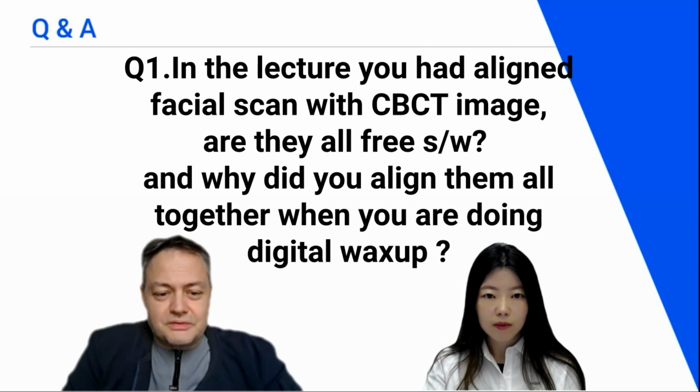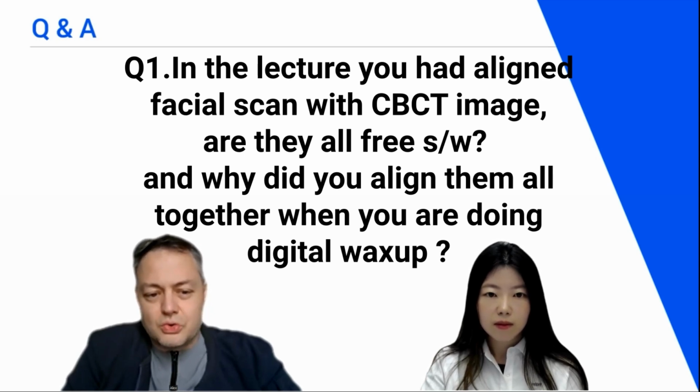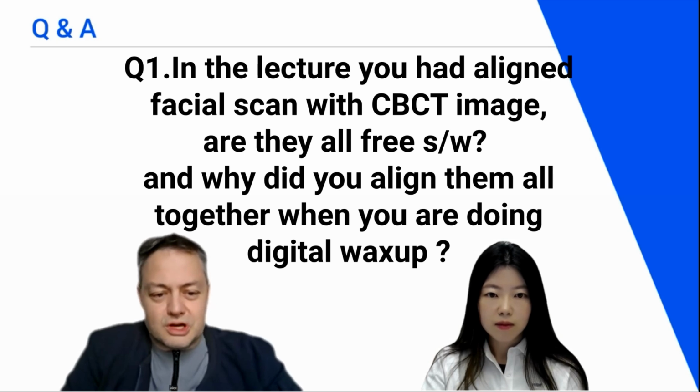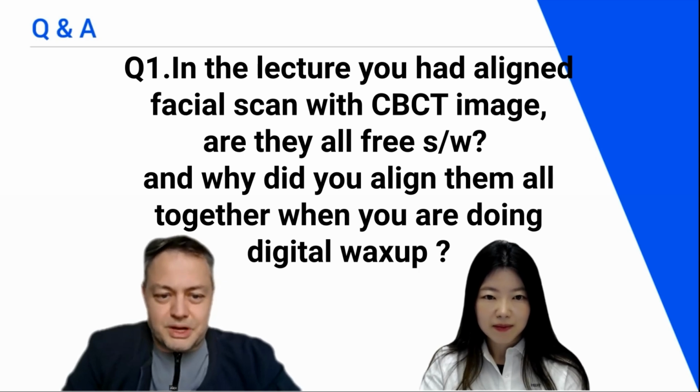And also, after you have the face in place and you are able to work on the smile of the patient, you will actually also need to work on the length of the crown. And to be able to do this, you need the position of the bone beneath the actual scans, and you merge the position of the bone and the roots and everything together, and you are able to now do crown lengthenings, or to plan maybe a Zucchelli technique. And everything is going to actually integrate, and with some programs you even can extract the pulp chamber, and you can see how to prepare the wax up so that you are not impinging even on the pulp chamber. So everything comes together in a nice big digital patient that is very beneficial for the planning in the end.